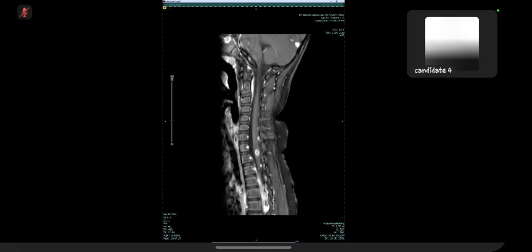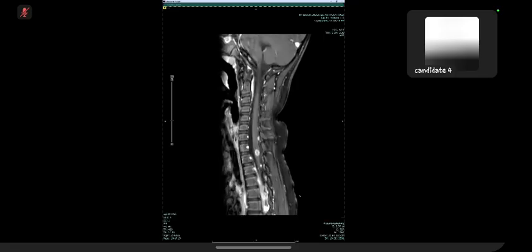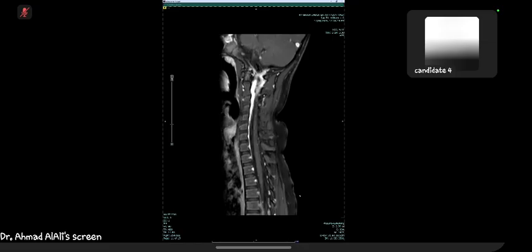These could be posterior fossa lesions. I cannot see any in the provided images, but medulloblastoma, ependymoma, choroid plexus lesions, and pineal region lesions are all sinister for causing metastatic disease process. So I would like to suggest imaging evaluation of the entire neuroaxis, including the brain and the spine, with contrast to look for the primary lesion and also to completely evaluate the metastatic disease spread.